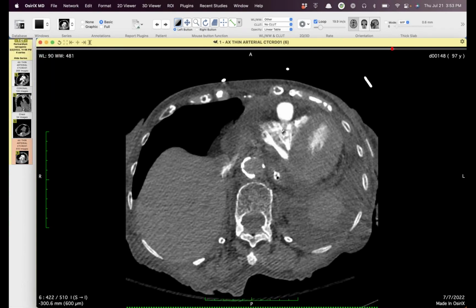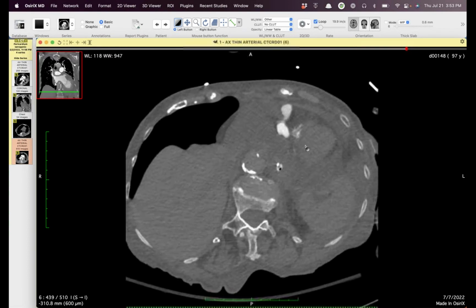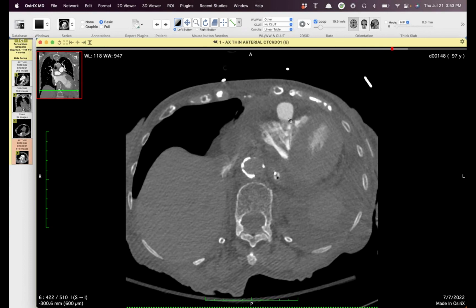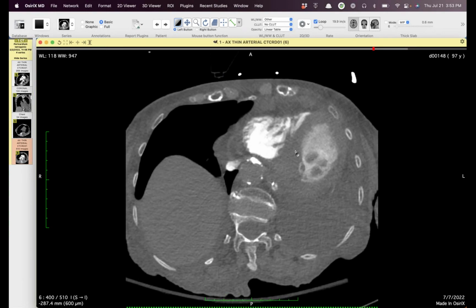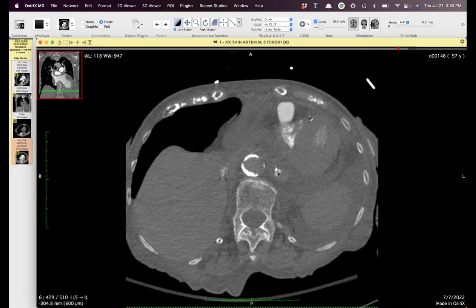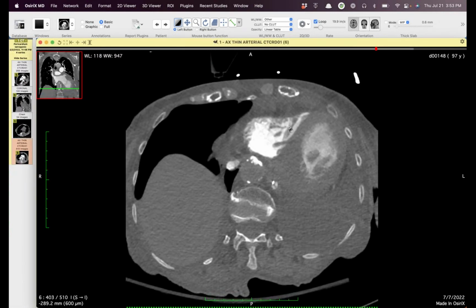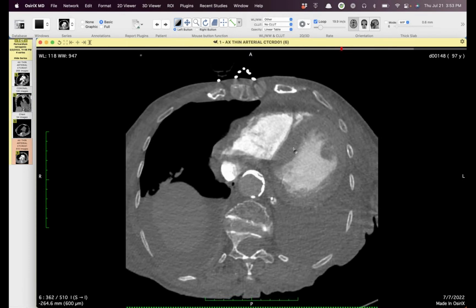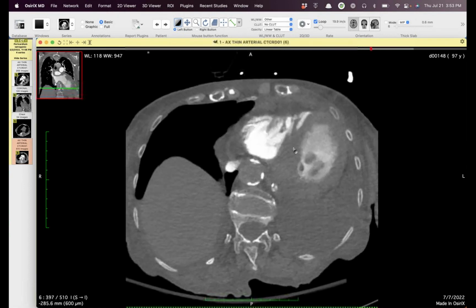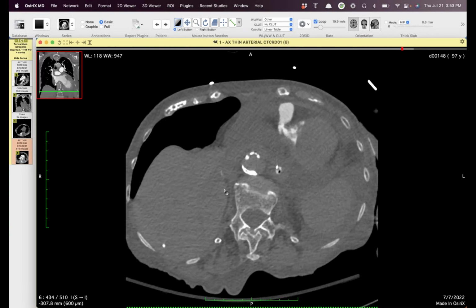But look at her right ventricle here. And she has this balloon that is connected to the right ventricle. So, pseudoaneurysm from the right ventricle. And looking, I don't see any rib fractures or cartilage fractures around that area. But this is certainly something, laceration of the heart can be associated with resuscitation. Everybody agree, right?